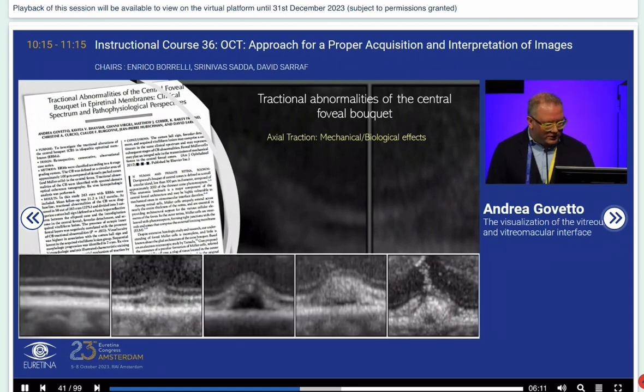And so what are these things that are happening in the fovea, in the epiretinal membrane, or in vitreomacular traction, for example? So you see these beautiful horizontal lines because all the cells there are perfectly aligned. When these cells are not aligned, so they are pulled up by traction, you lose that reflectivity. And so you start seeing something called the cotton ball sign, which is this one.